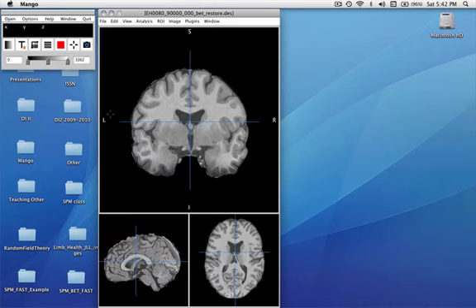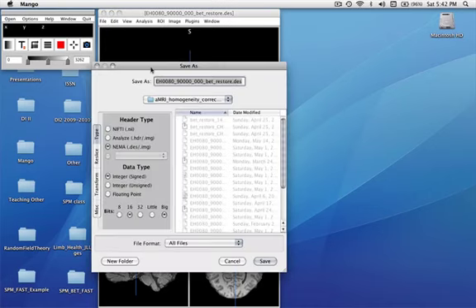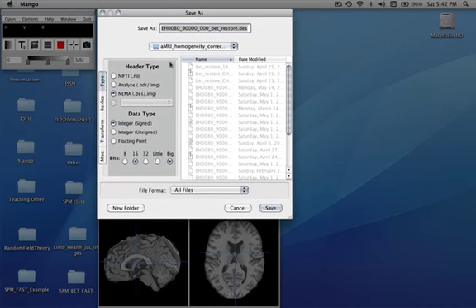So, we've shown how to navigate an image, and we've shown how to use the grayscale with an image. One other item to see in the beginning, and to know what to do with images, is how to save one. So, let's go to Save As, and it opens up a nice dialog that has 4 different tabs in it. The first tab indicates what type of image you want to save it as.